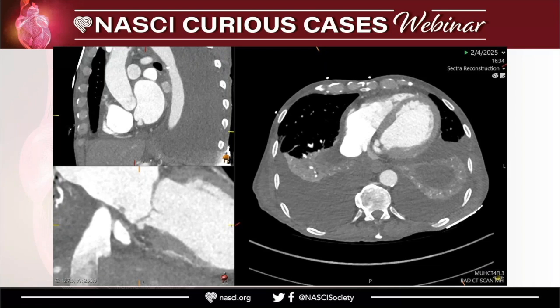Yes, yes, yes. And why would it happen? Yeah, there should be a reason why it is happening, and most of the time that reason is infection, so you will often see an abscess. When a patient has a valve prosthesis, in the long term you see the pseudoaneurysm. You may not even see the hypoattenuated area, still you will consider it an abscess, because what else could cause that, unless trauma, maybe penetrating or non-penetrating. Yeah. Any other comment?